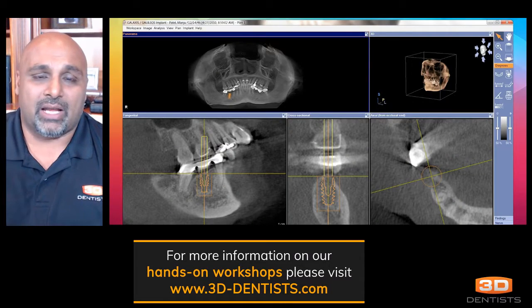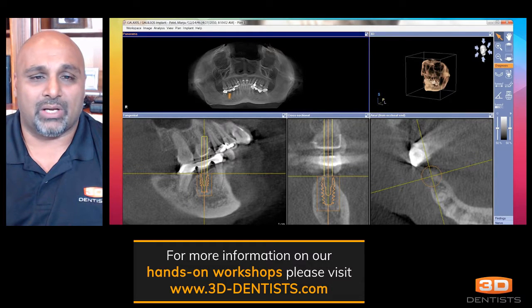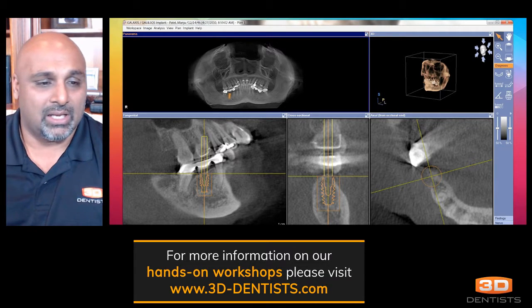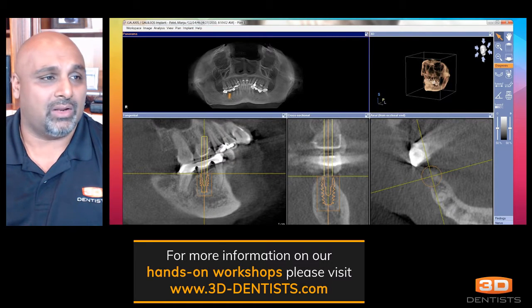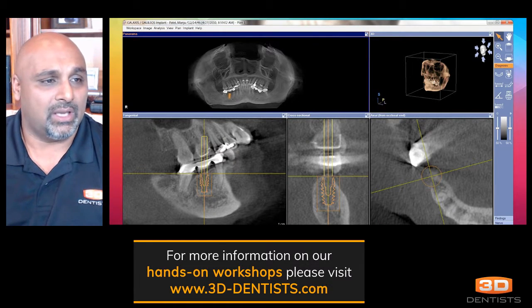And to give you an idea, I always like to show this slide here and ask the question, how is this implant placed? Are we happy with this placement?